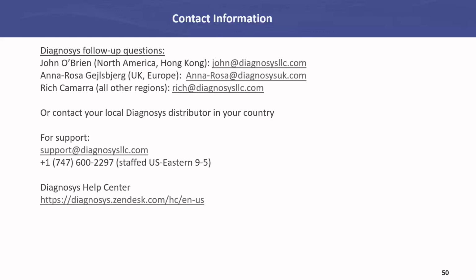So in regards to export of your data, when I talk to people, they're very much aware that with our software, just like with the protocol, we give very powerful tools to people to generate protocols. We also allow everyone to get to all the data. We don't hide any data. We allow you to export the data, take the data out to something else. There are tools for you there to take them out, so that everyone has the ability to access all the raw data, take it further, and do further analysis.